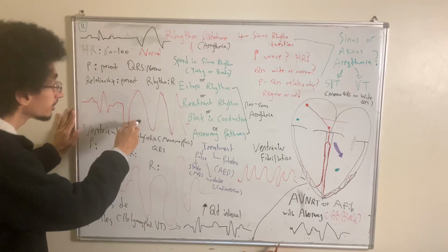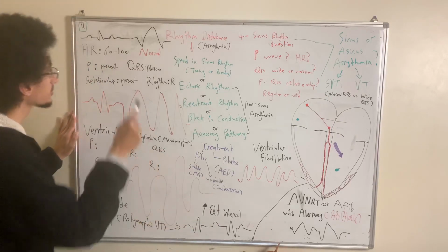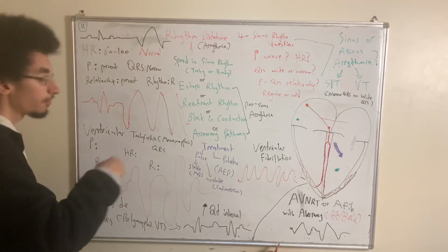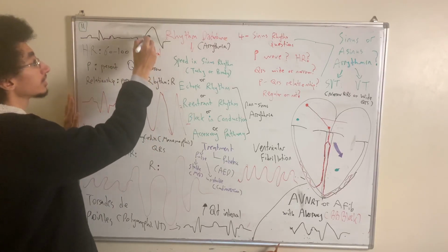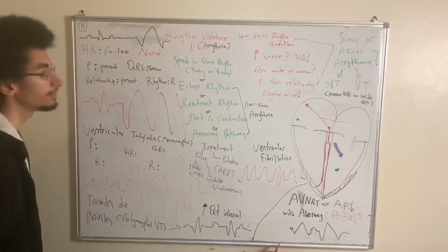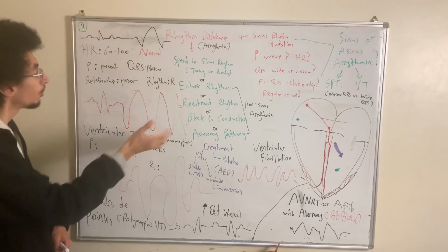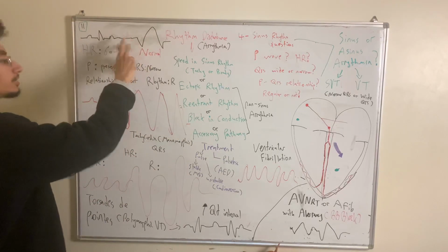If it occurs late, such as in this one, where you can see a normal sinus beat, and let's say there's a sinus arrest or asystole, and then suddenly you'll see the presence of a wide bizarre QRS complex. This occurs following arrest. Then this is the same characteristic as this one. This is known as an escape beat. An escape beat has the same characteristic in EKG as a PVC. The difference, this is premature. This occurs early, as soon as or before the previous beat finishes its repolarization. But this one occurs late, following sinus arrest.